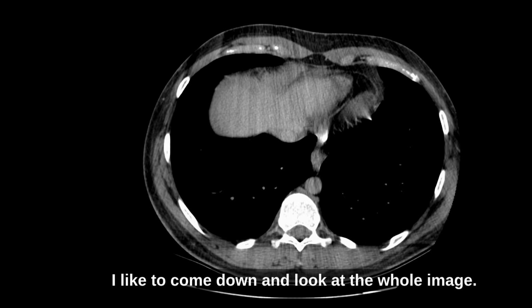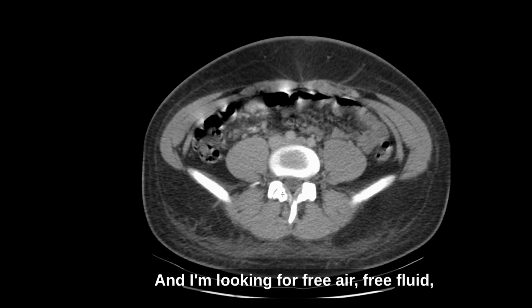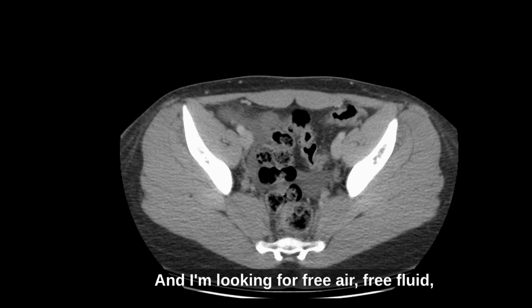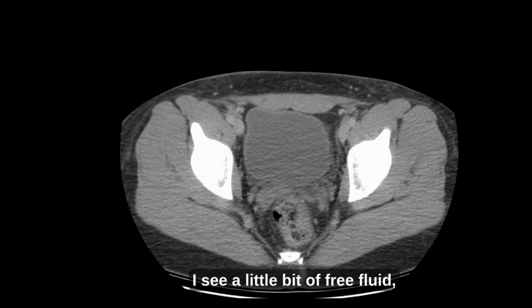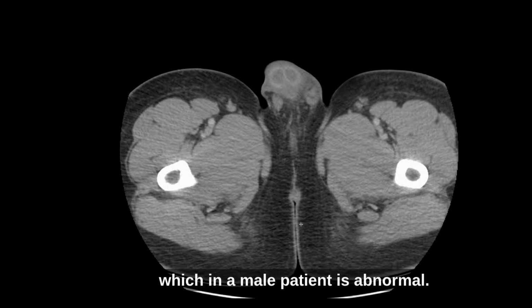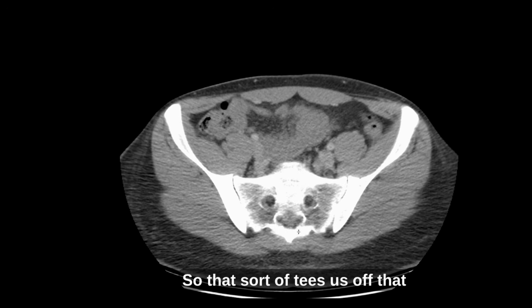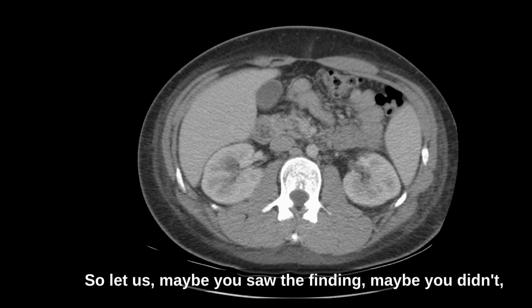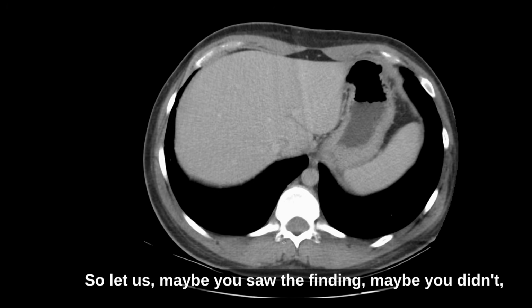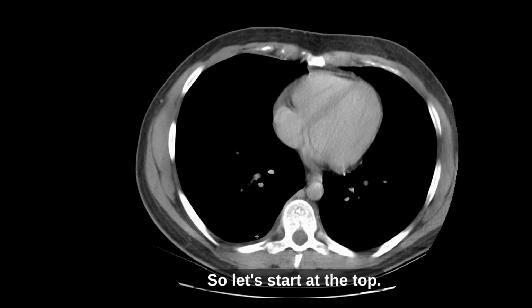I like to come down and look at the whole image, and I'm looking for free air, free fluid, and to see if anything jumps out at me. Coming into the pelvis, I see a little bit of free fluid, which in a male patient is abnormal. So that tees us off that there might be something abnormal. Maybe you saw the finding, maybe you didn't, but we'll have a couple of opportunities to look for it. So let's start at the top.